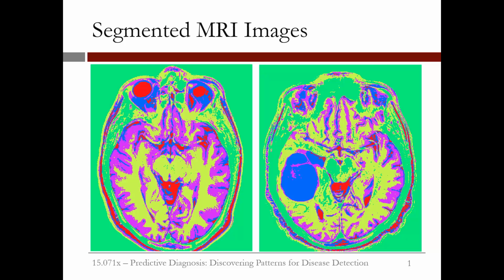For the sick patient, the substance highlighted in blue is the oligodendroglioma tumor. Notice that we do not see substantial blue regions in the healthy brain image apart from the region around the eyes. Actually, looking at the eyes regions, we notice that the two images were not taken precisely at the same section of the brain. This might explain some differences in shapes between the two images.